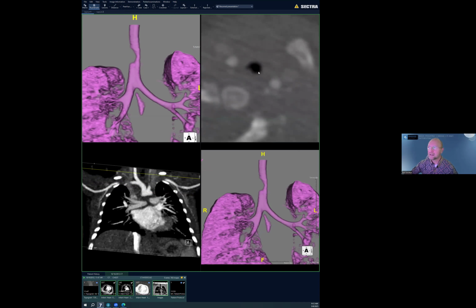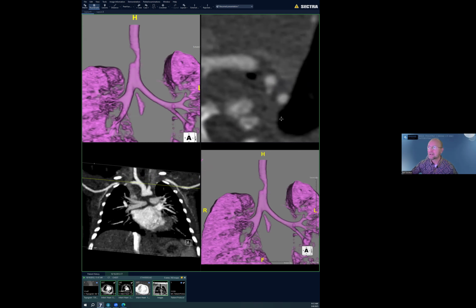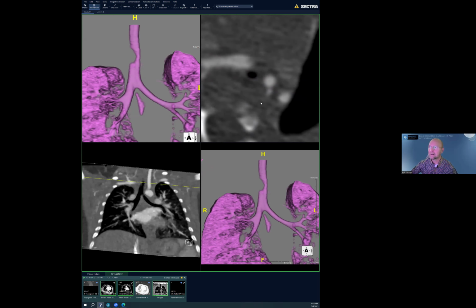Like Dr. Amal said, I'm going to reiterate that because it was an excellent and very important point to look at the morphology of the trachea. In this case, you have a C-shaped cartilage anteriorly and a posterior, more membranous portion that's flimsy. But as you scroll down, right here, the trachea gets extremely narrow. So again, it's helpful to co-register your images and see where that narrowing is in the other views.